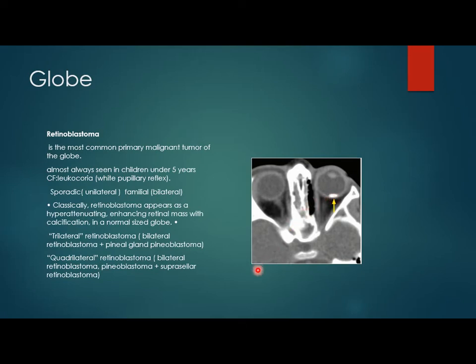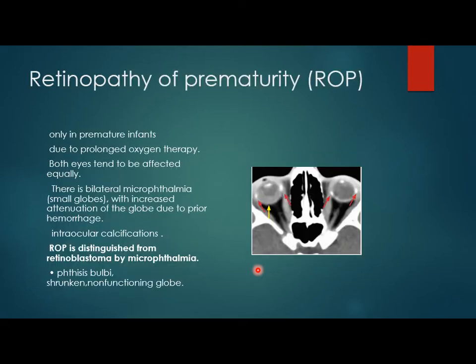Anyway, no problem. Okay. Why is this image not retinoblastoma? Retinoblastoma should be a mass. This is calcification within the globe. There is no mass, first. Second, it should be a child. The bone calcification pattern shows this is an adult. I don't think there is an aggressive, invading, destructing, enhancing mass. It's just a spot of calcification on the globe, so it's more in favor of drusen rather than retinoblastoma.